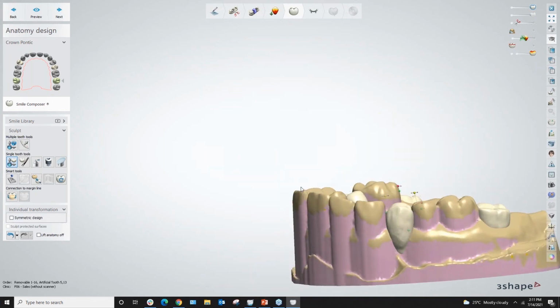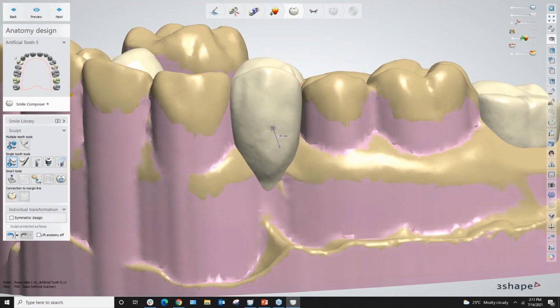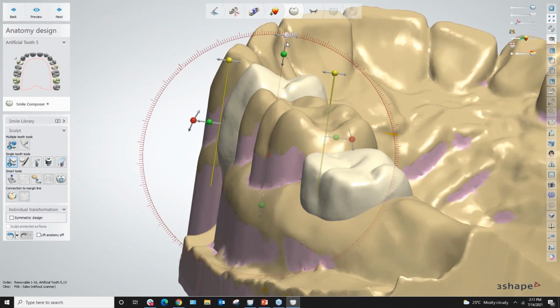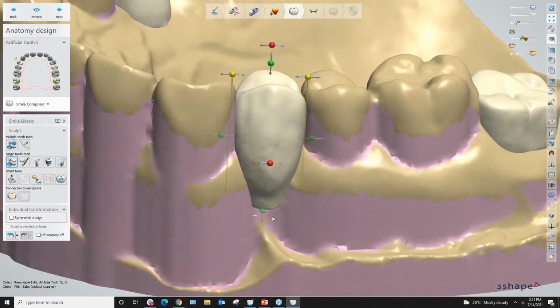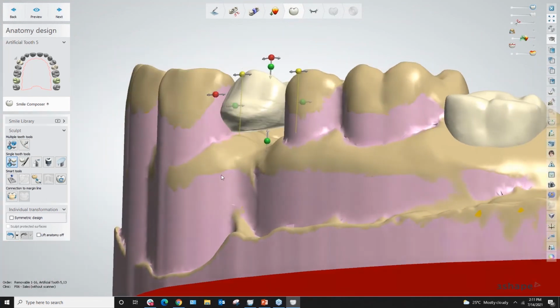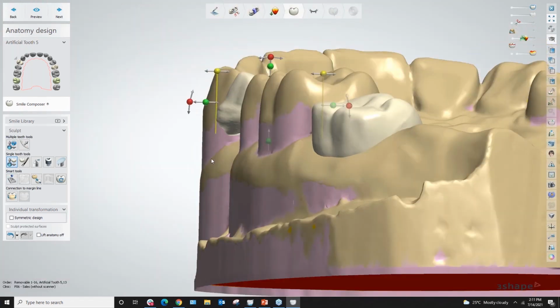And one by one, just moving forward and working single tooth by tooth, giving it a decent position as a preliminary position. And from there on, reducing all the way to my gingival area. There's also the option to use the Smart tool, but I prefer reducing it myself.